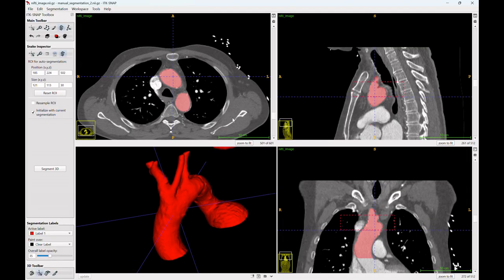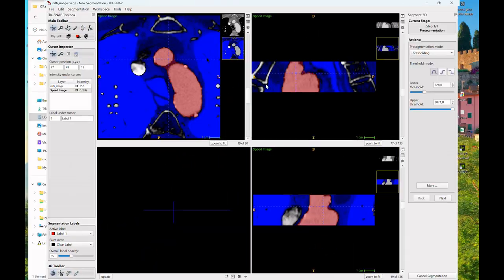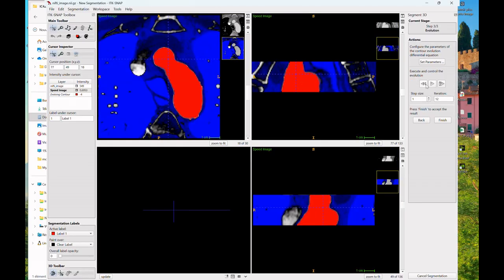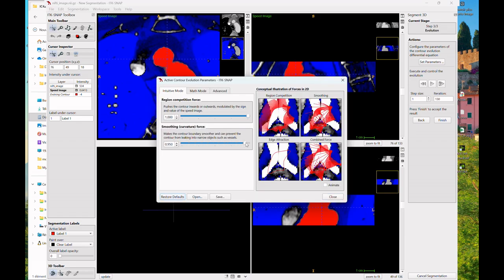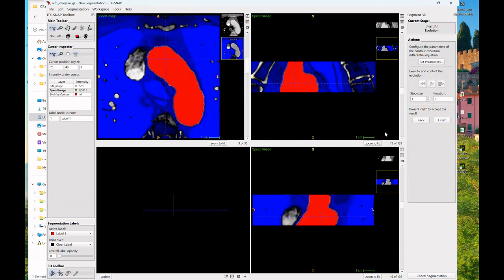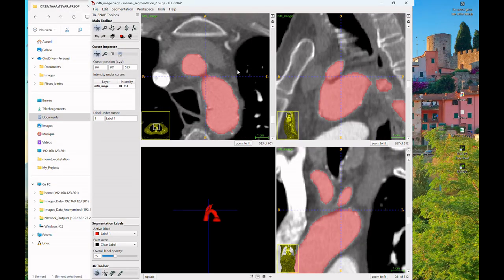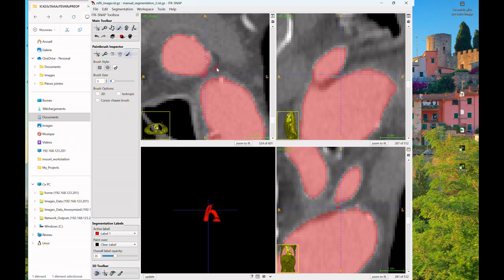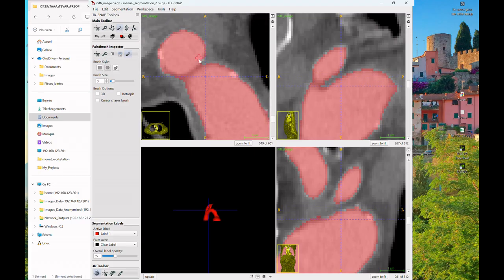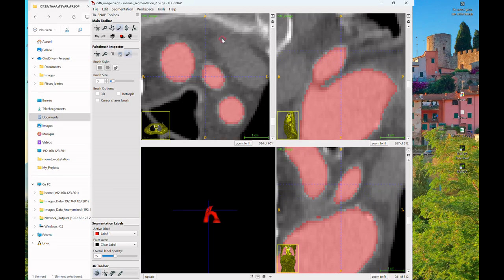The same process is then applied to the other sections: the aortic arch, the supraaortic branches, and the descending thoracic aorta. For each area, the method remains the same. Precisely define the working region. Adjust the intensity thresholds to control propagation. Modify the smoothing parameters and the number of iterations. Check the rendering before validation.